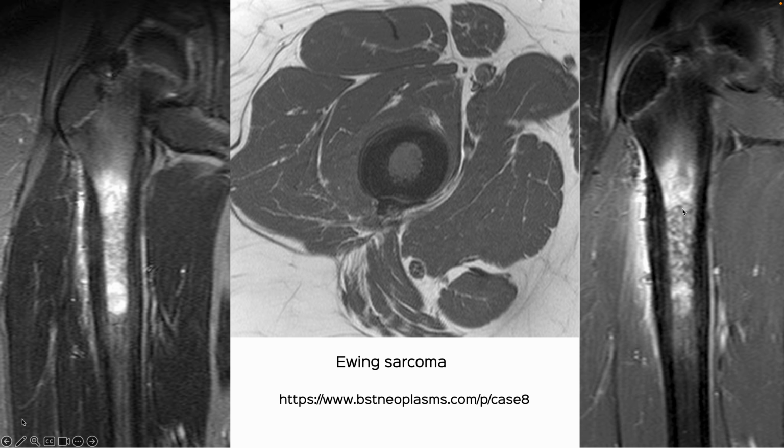But one of the things that helps differentiate is that Ewing sarcoma is often very sharply demarcated, and the marrow edema wouldn't be that significant. And you see a diffuse periosteal reaction here. Again, this could happen with osteomyelitis as well. I had biopsied this, and this was Ewing sarcoma. So, yes, when you have typical findings of a collection with pus, that's osteomyelitis. Non-necrotic soft tissue would be Ewing's. But in these kind of situations where you have only bone involvement, it can be a challenge.